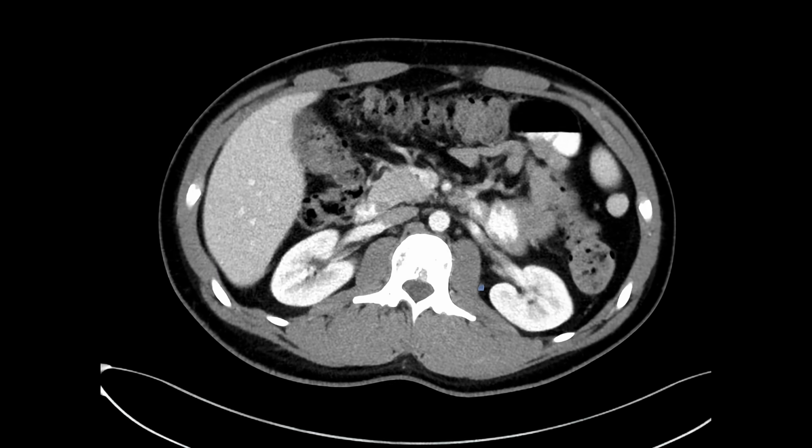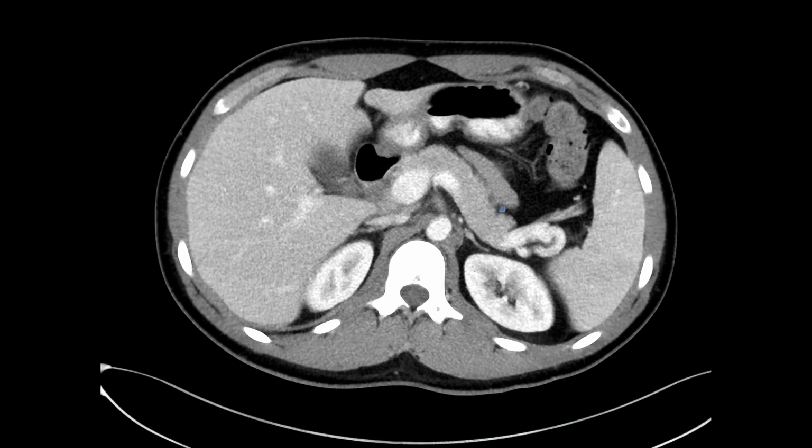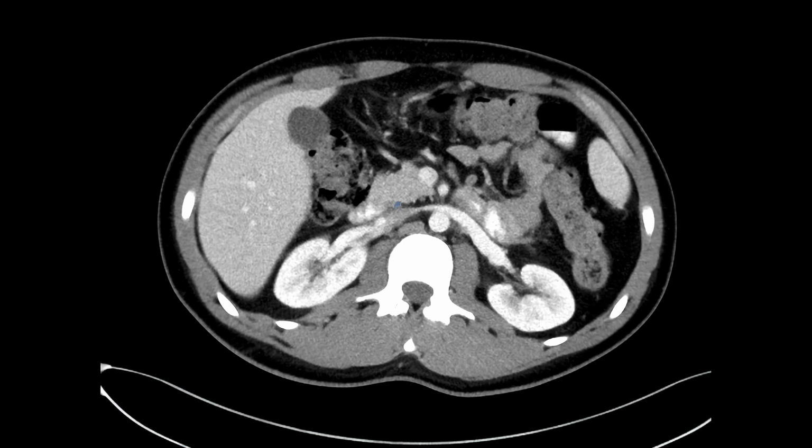So the dorsal pancreas actually ends up twisting around and refers to this larger portion of the pancreas that ends up anterior. And the ventral pancreas refers to this posterior component that actually ends up dorsal. So remember, in the pancreas, dorsal and ventral pancreas are reversed.